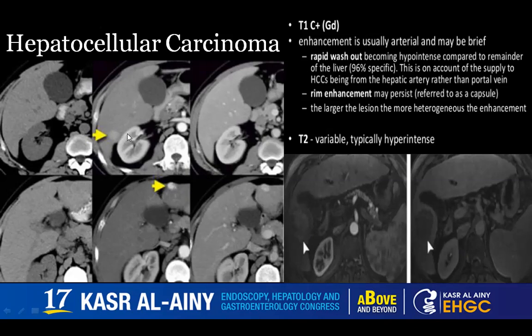The main difference is washout. Here, I cannot discriminate the lesion. Here, the lesion is still obvious. So this is hemangioma, but this is HCC.